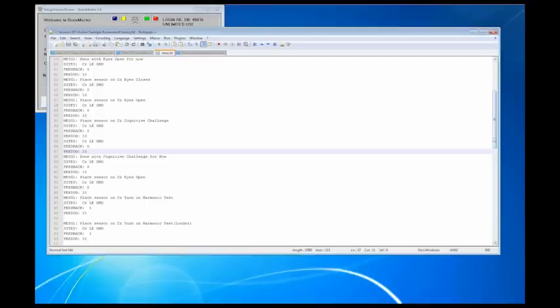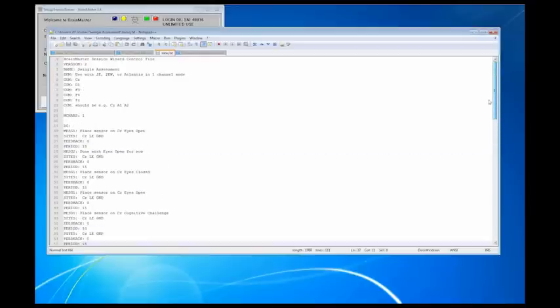Okay. So now that we've got some basic information on that, what I want to show you in this session, or in this folder in particular, is how to make feedback. Gary Ames's file is basically an assessment of the clinical Q. It takes the information and the data that's been collected from the clinical Q or from the Swingle assessment, and it gives you some clinical insight as to what might be going on.